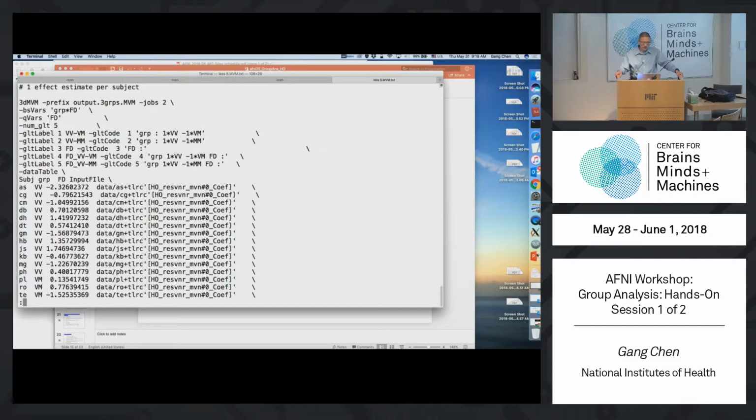So the next few lines basically specify the post hoc tests. For example, the first one, we want the contrast between those two genotypes. So for the coding, we just put the weights in front of each factor level, either 1 or -1 typically.